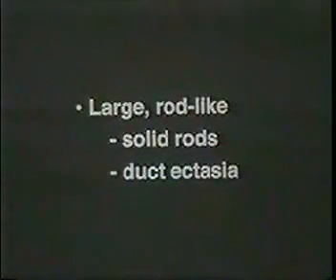These, unlike carcinoma calcifications, are solid, not made up of multiple microcalcifications, but solid calcifications, and are typically associated with a condition called ductectasia, sometimes called secretory disease. And these calcifications are usually more separated than those of malignancy. They don't branch generally, as malignant calcifications tend to do, and are easily separated from malignant calcifications by these morphologic features.